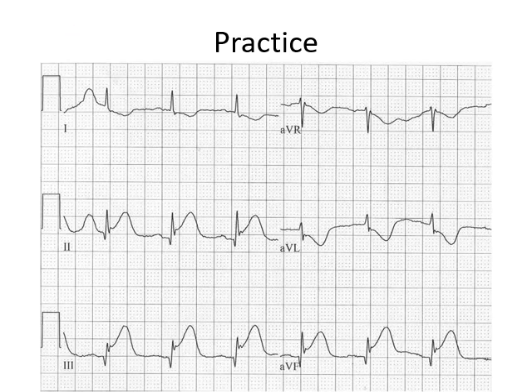Let's interpret one more ECG. I will take a 1-second pause. Alright, so let's look at ST segments. If this is the TP segment of lead 2 and this is the ST segment, you can comfortably say that the ST segment looks elevated.